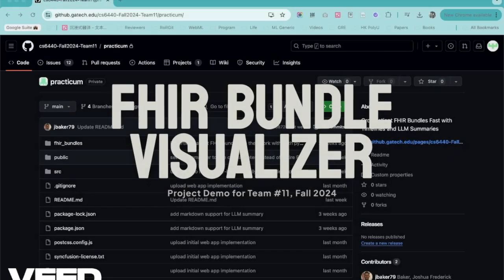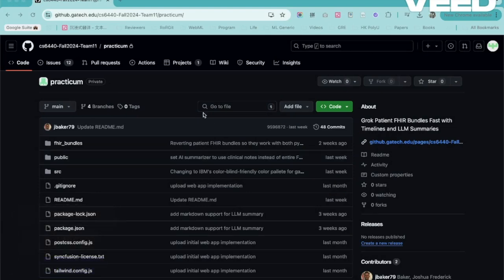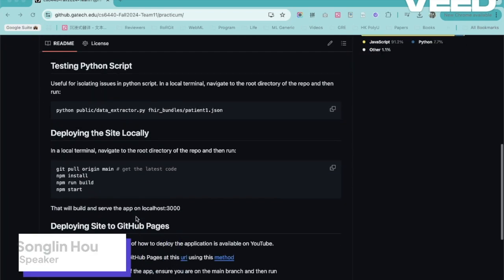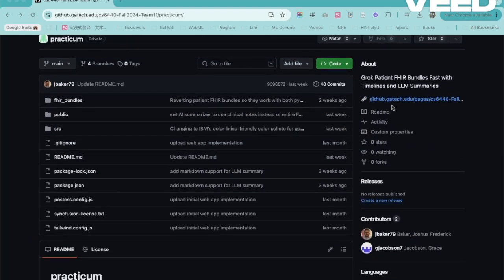Guys, in today's video I'm going to show you a demo of how to use our FHIR bundle visualizer. This is our final project. First, this is our GitHub page, and we have the README file which can help you to set up a local environment. But in today's video, I'm just going to go through the hosted one which we have on the GitHub page.